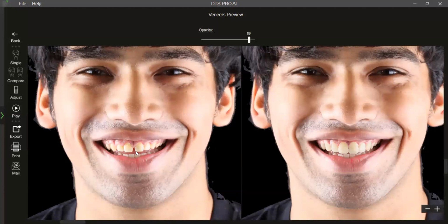So you can start with a photograph, end with a photograph, where you can understand the entire process of simulations, 2D planning, going ahead to the next step, 3D planning on the patient, and doing 3D printing and mockup transfer. I repeat, there will be a separate webinar on the 2D to 3D workflow, which you can definitely join once you have the link with you. And then finally, the processes which you share with the lab. So that is the basics about the 2D software of DTS Pro.